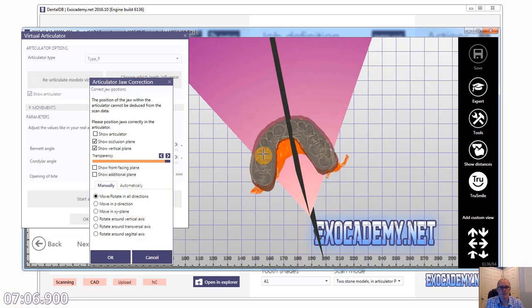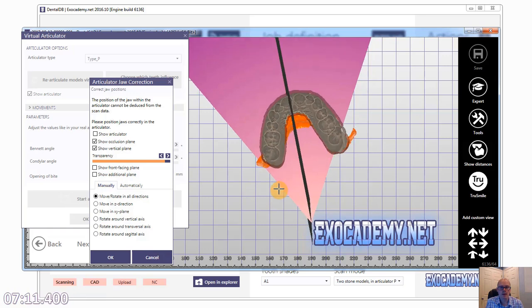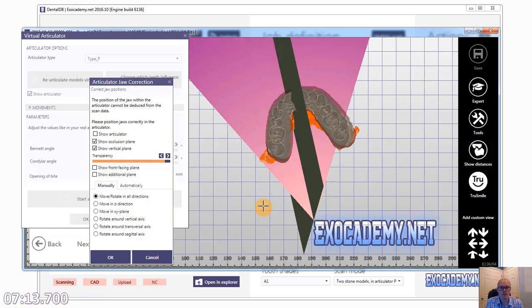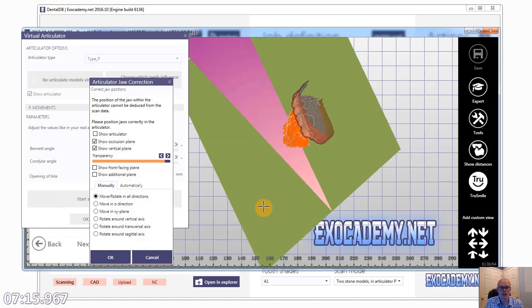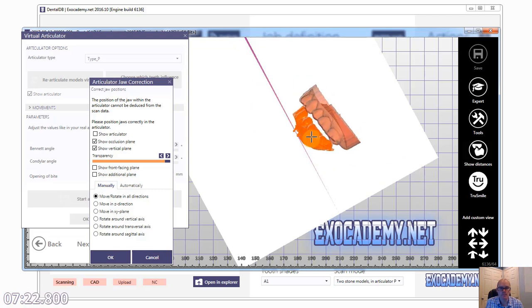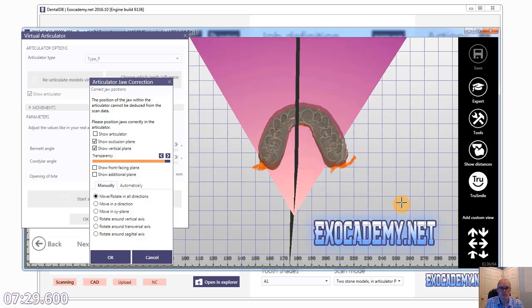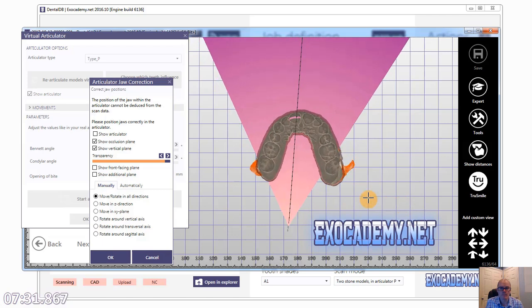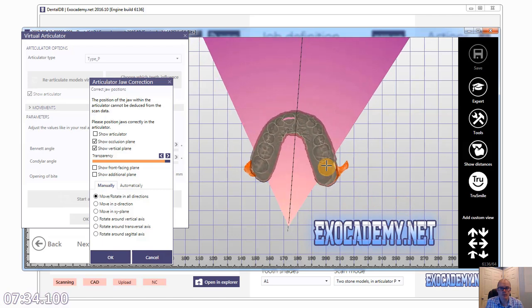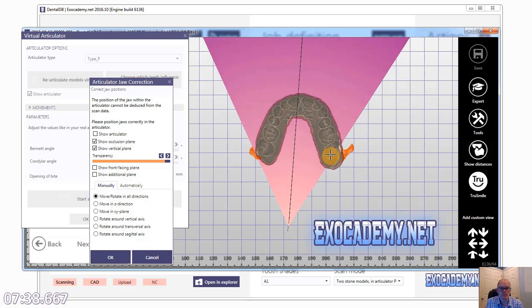Left click and drag to move the models in this view. If I right click and drag outside of the models, the whole view rotates. Now, in this two-dimensional view, I can move the models up and down, up the z-axis. I need to rotate the entire view to now move them in the XY direction without moving along the Z direction.